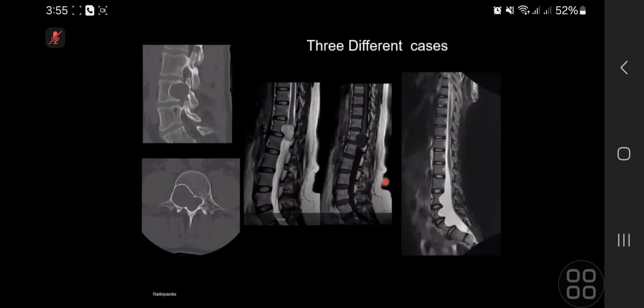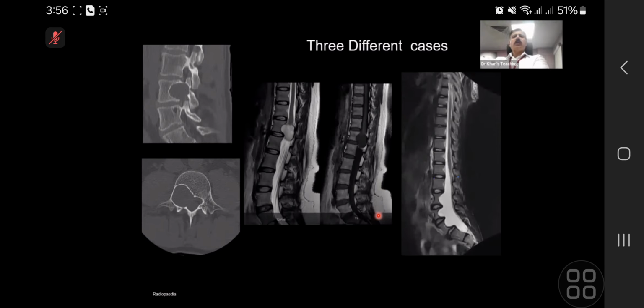These are CT and MRI images of the spine. Within the CT images, I can see sagittal. So, excuse me, these are 3 different cases. So you can describe 3 different. Just confine yourself to this one, then this one, then this one. All right, I'll start by the far right one because it's the obvious one.